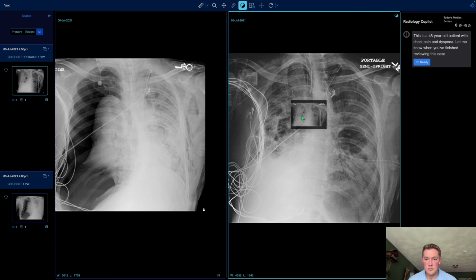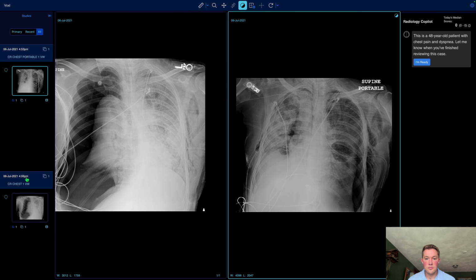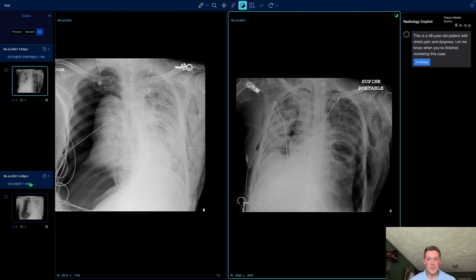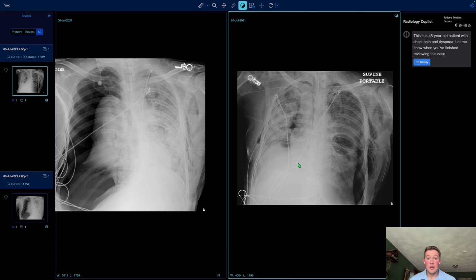And this is literally within the hour. We scramble the times, we anonymize the times, but the time between the studies is preserved. Yeah. So this actually did happen within the hour. And can you tell me what's the main thing that happened? What are the main things that you see on this study within 60 minutes of this one here?